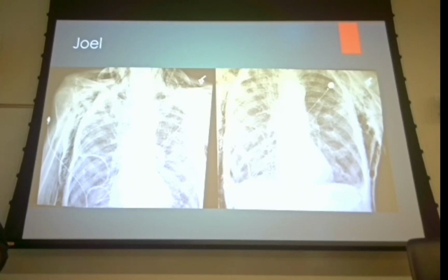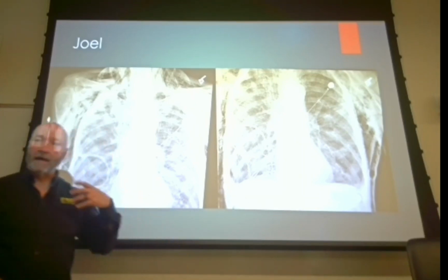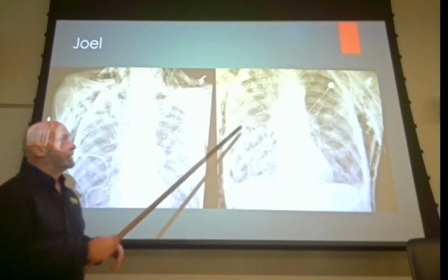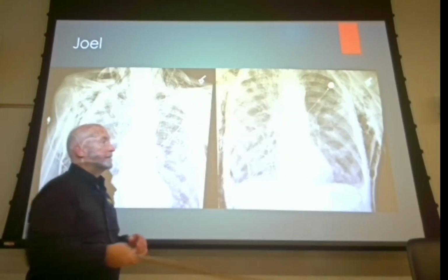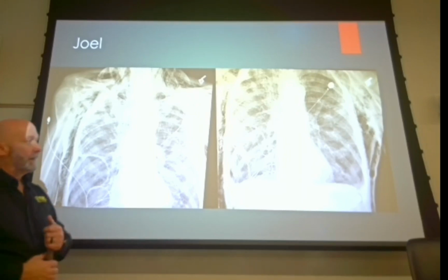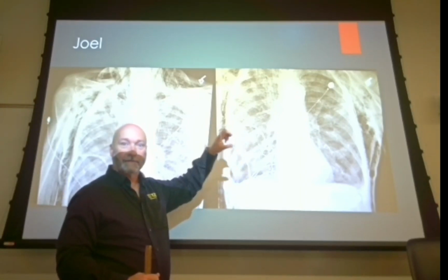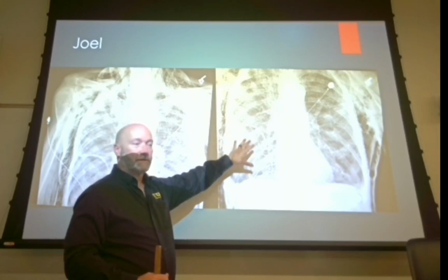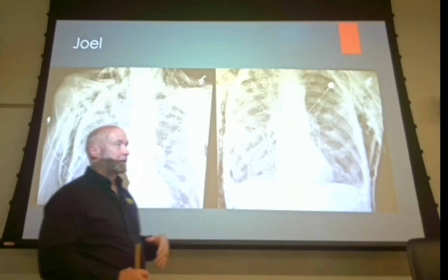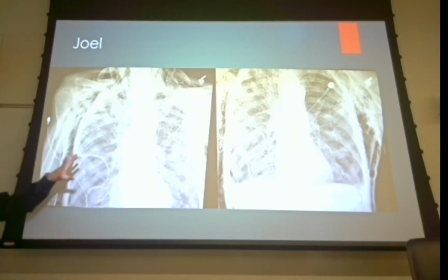In a trauma situation, the air comes out of the lung, out of the thoracic cavity, and into the muscles in the chest. So it's subcutaneous emphysema. All right, so subcutaneous emphysema is just extravasation, essentially, of air into the muscles in the thoracic cavity. And you can tell that the patient has subcutaneous emphysema just by touching them.